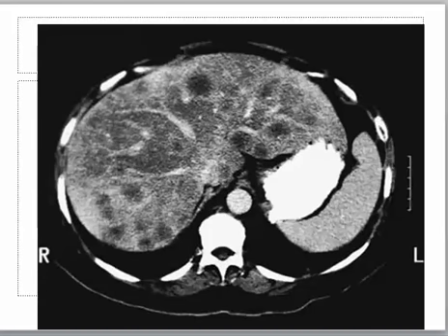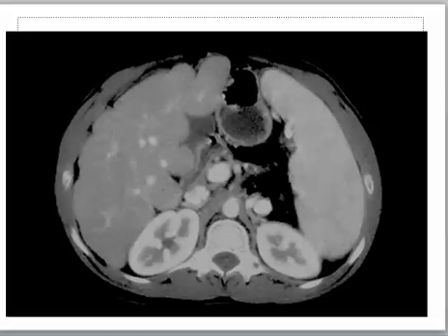Here, this is the example for metastatic deposits, usually of adenocarcinoma, because the content is mucoid. And this is the macronodular surface of the liver in liver cirrhosis associated with a large spleen.